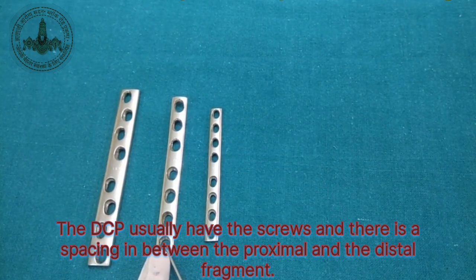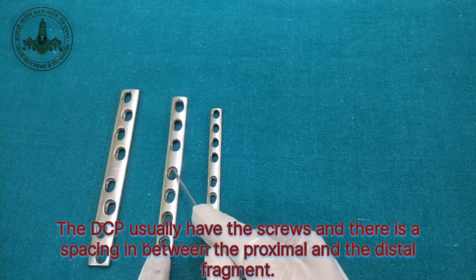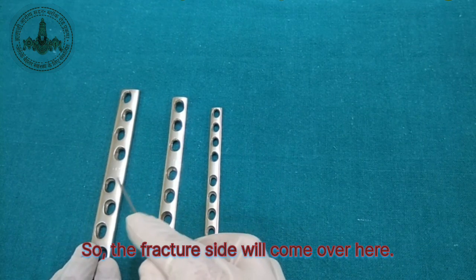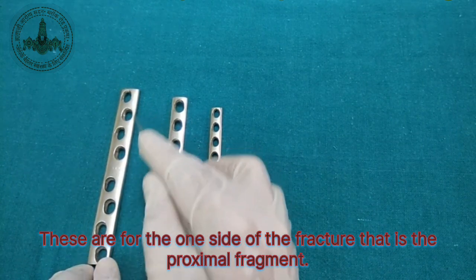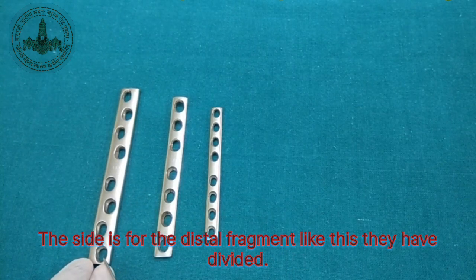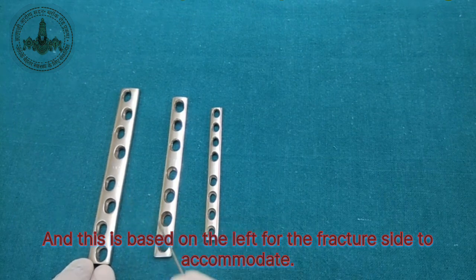The DCP usually has screw holes and there is a spacing in between for the proximal and the distal fragment. You can see here that there is no hole. It is for the fracture site. So the fracture site will come over here. These holes are for one side of the fracture, that is the proximal fragment. This side is for the distal fragment. Like this they have divided, and this space they have left to accommodate the fracture site.